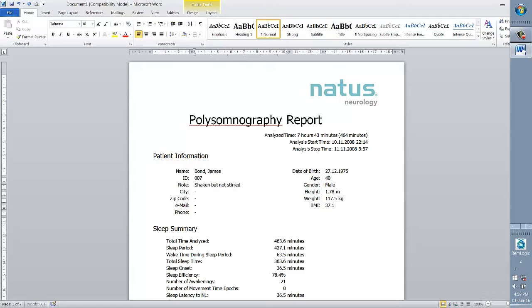So I would like to reiterate this again, the Enterprise does not save or keep raw data. They only keep the clinical outcomes, the statistics only, and of course the reports that you publish over. So we just have to wait for it to tell us that it has been published successfully. Oh yes, it's done now.